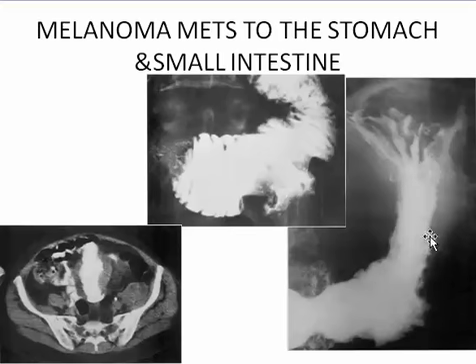Again, the stomach and small intestine, as well as here in the pelvis, sigmoid.